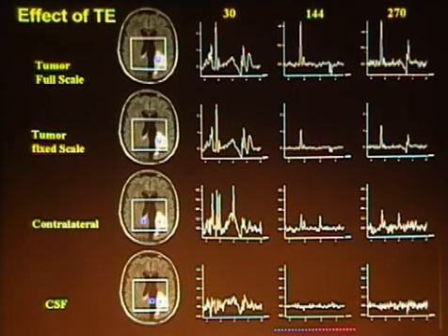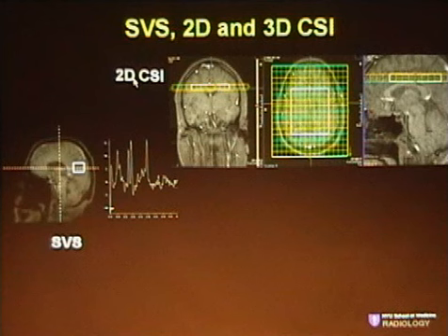Lastly, almost lastly, you'll see some myo-inositol here, which we won't see at longer echo time. And then lastly, you can see that if you put a voxel within the CSF on the lower voxel, you really shouldn't see any metabolites at all.